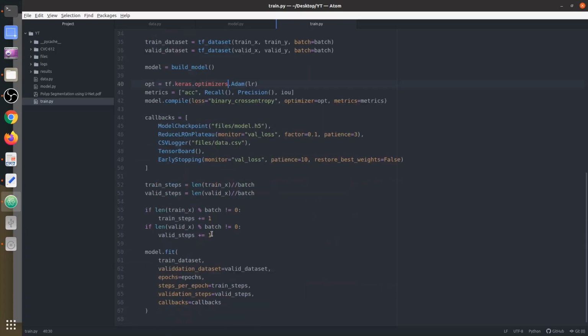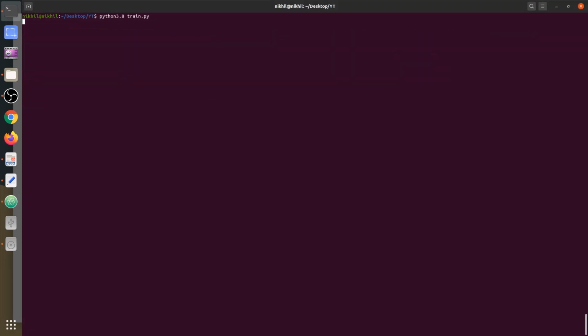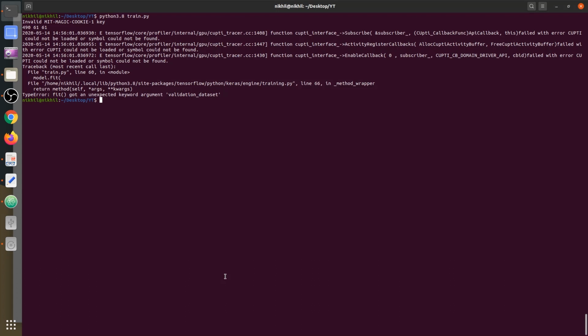Okay, again spelling mistake, I know. Seems like I'm very eager, very fast. Doesn't check. Again unexpected. Okay, it should be validation data. My mistake.